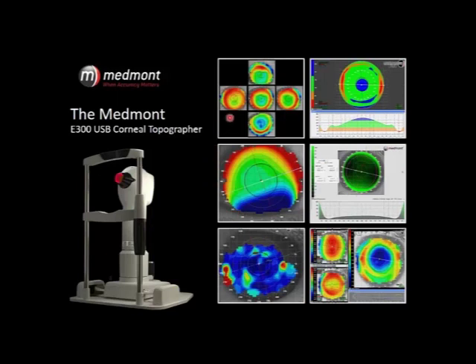With the composite map, that allows us to image 100% of the visible iris. Then we can convert that to an elevation display and drop our specialty corneal GPs on eye. We can drop our scleral lenses on eye. The reflection-based topographer that the Medmont employs allows us to reflect off the tear film, so we can have an understanding of tear film breakup time, of the relative degree of dry eye that this patient is facing. And then in analysis such as orthokeratology, we have these beautiful displays with the Medmont that really help us to appreciate what's going on.